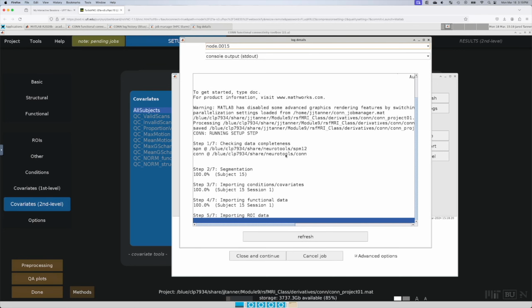And this step is not taking a long time. Larger data sets can take much longer to do, especially if you are having to run multiple participants on each core. Here we requested 1 core per participant, so it's pretty fast to do. But again, it can take some hours for this process. And if you have enough data, it can be days for this process. So be patient, and we'll be back in a little bit.